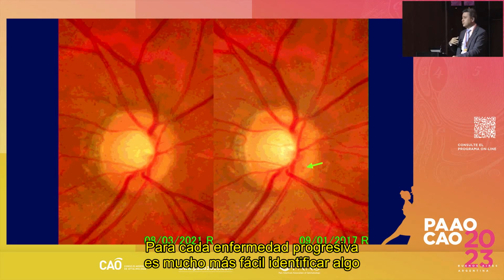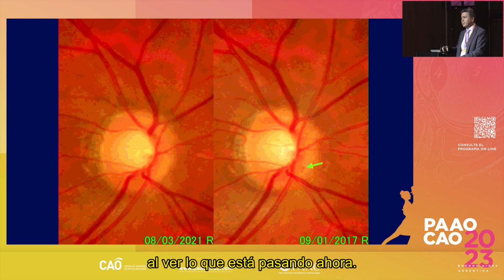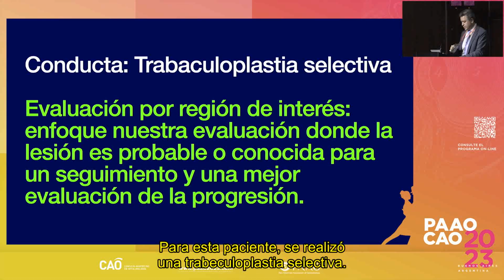With every progressive disease, it's much easier to see something if you do a longitudinal evaluation, and you can see in the past what you were missing by looking at what's happening now. So for this patient, selective trabeculoplasty was done.